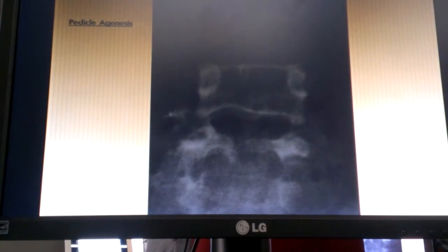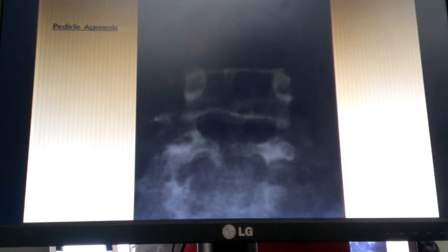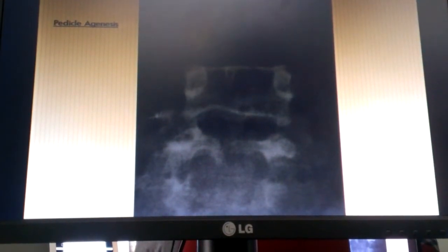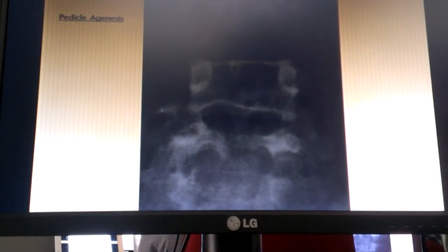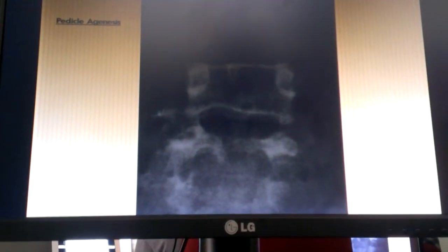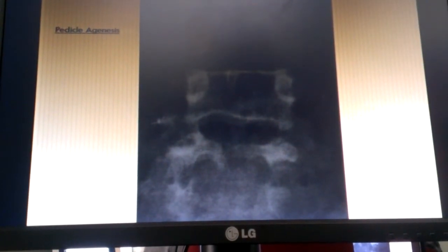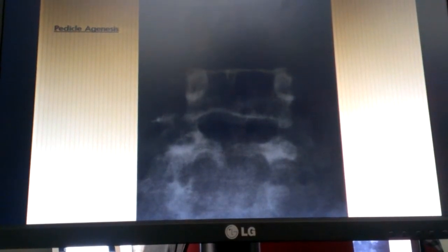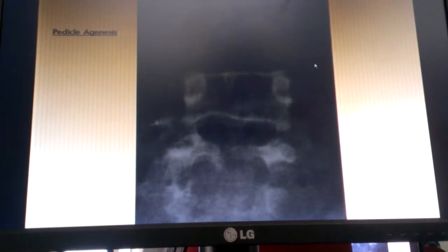So when the pedicle gets large and sclerotic on the opposite side of the missing pedicle, then that's telling, it's probably agenesis. But Yoakum talks about this, and you need to know that the most common cause for a sclerotic pedicle is what? Probably unilateral spondylolysis. Remember how I said that if you've got spondylolysis on one side, the spinous process will rotate to the side of the lysis, and the contralateral pedicle will get very sclerotic. So Yoakum says that that's the #1 cause for a sclerotic pedicle. Not that it couldn't be degenerative change, not that it couldn't be something like this, but usually, more commonly, it's the other. It's unilateral spondylolysis.